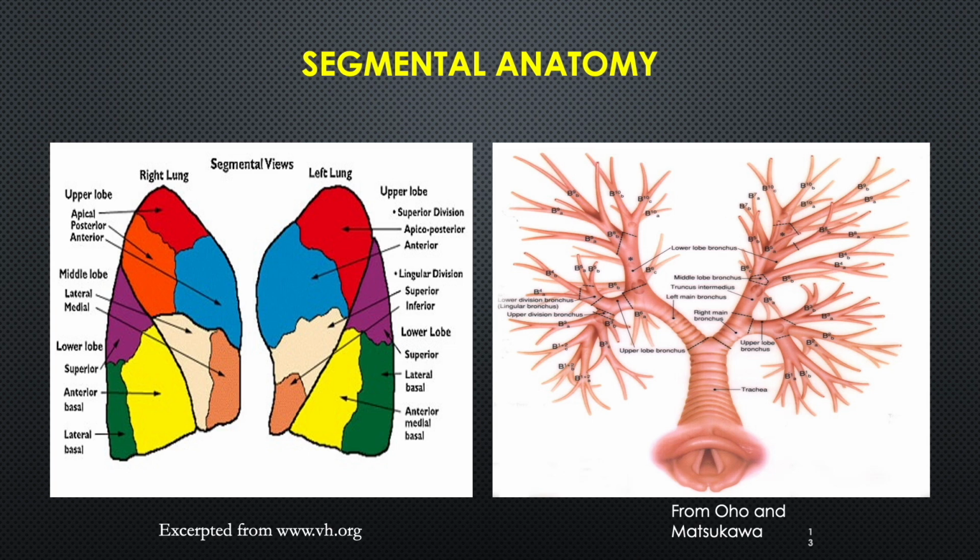Coming back to where we started, now we've all revised the right lung and the left lung and the segments, and it'll be helpful here to again understand the bronchoscopic view and realize that according to the segment we know that there are bronchial segments. So the international nomenclature of RB1, 2, LB1, 2, 3 and the middle lobe and the lower lobe, that should corroborate with it. So now I'm going to talk about the second way of analyzing the lung segments, which will take care of the bronchial anatomy also. So let's go into it.